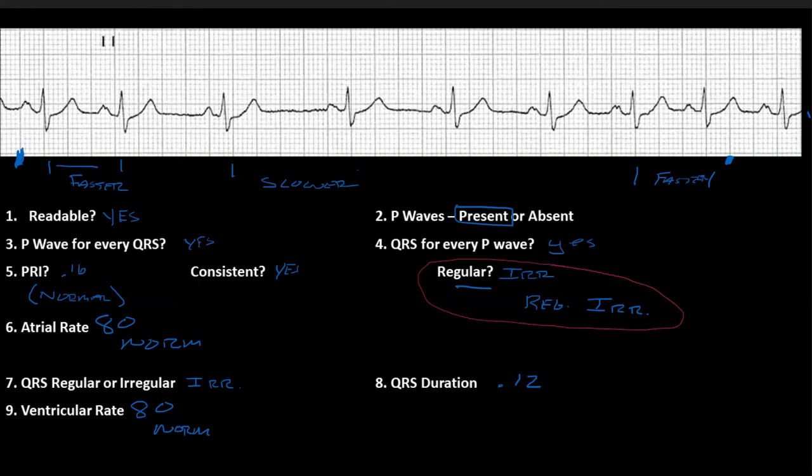This is a wave that comes up here. You see that here in this area, it got a little faster, and then it got a little slower, and then it got faster again. So in these areas, you can see that things actually break up.